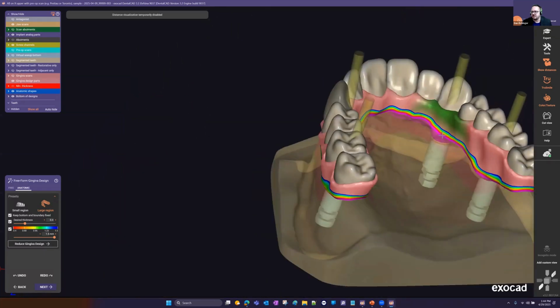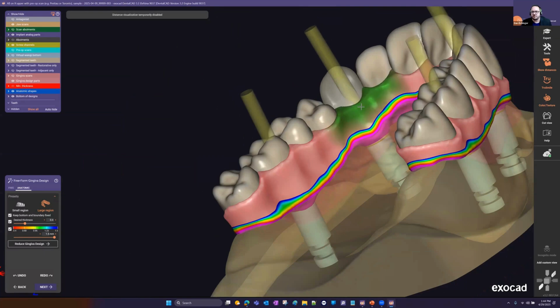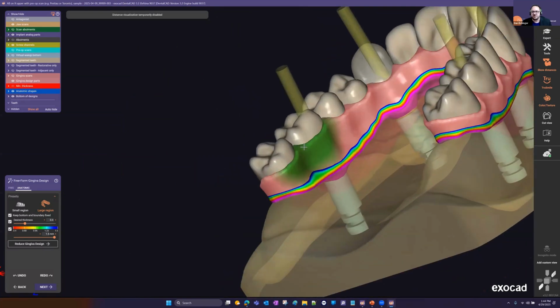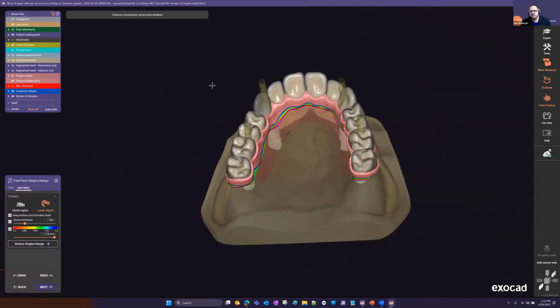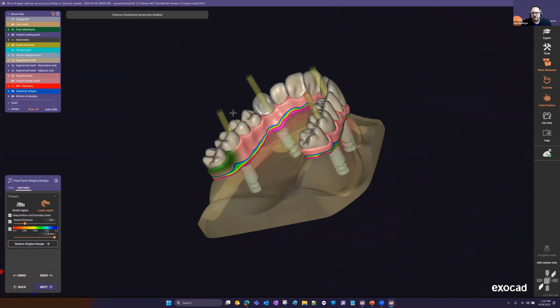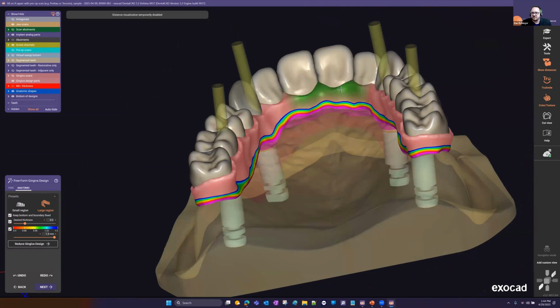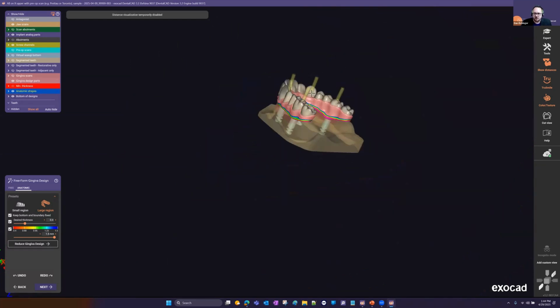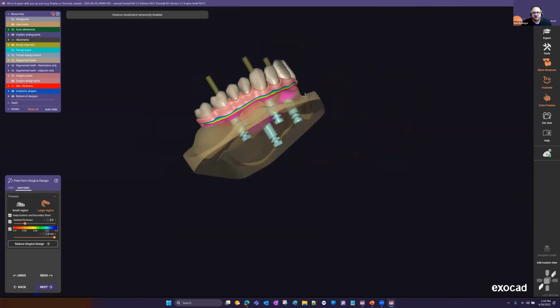With the segmented teeth, it's not a true library, so there aren't as many defined regions, or any defined regions, I should say, at this point. So with the proposals, you might have to drag down the linguals or drag up the facials, depending on the segmented teeth themselves. But just some simple left click and drag operations here.